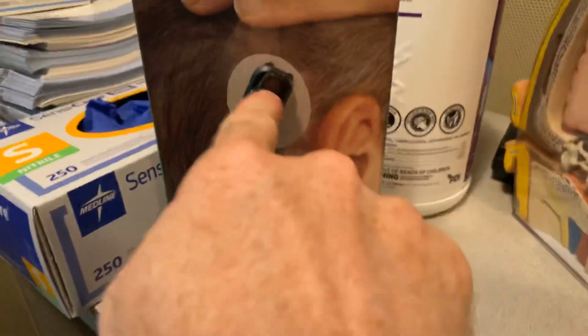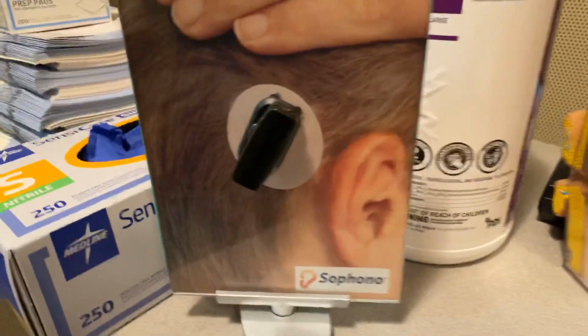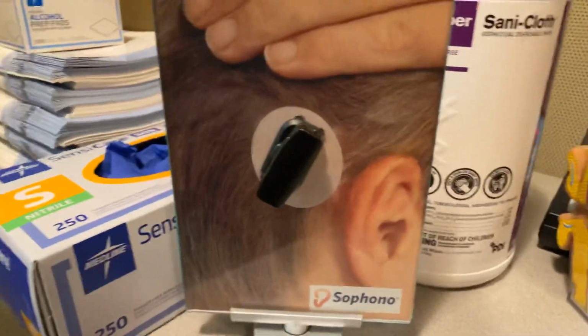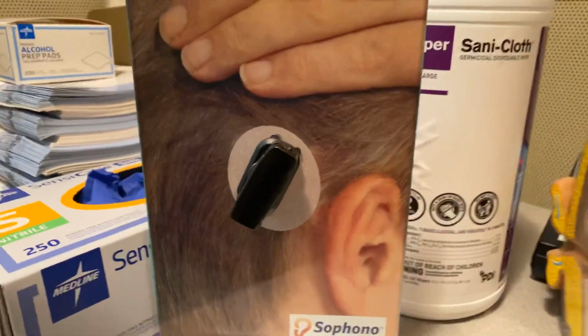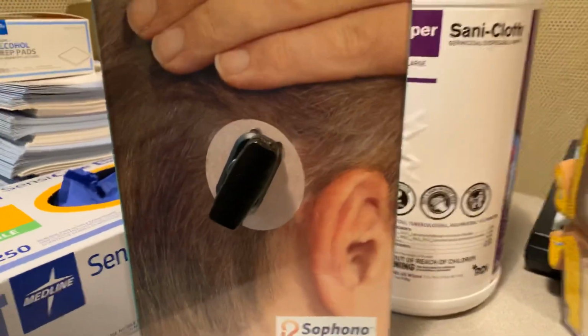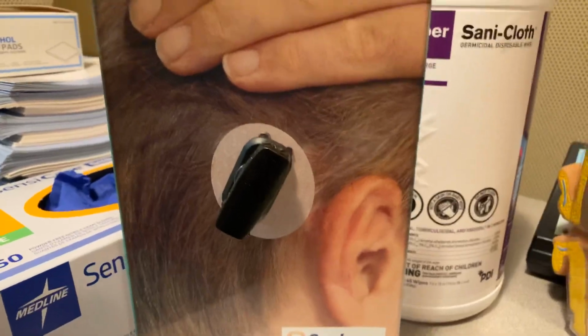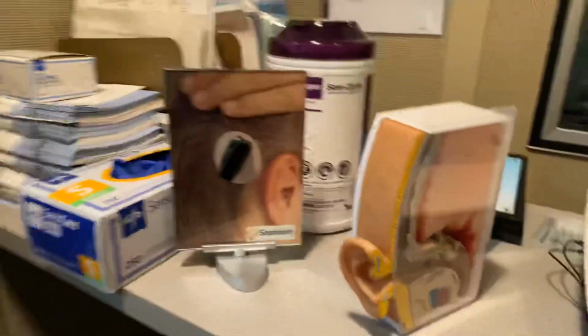This person would perceive sounds coming at them on their right-hand side, even though it was really the left cochlea hearing it. That is amazing to me. If I think about that too hard, it still amazes me. It means the person has localization again, a little bit of hearing in stereo, even though they have one dead ear.